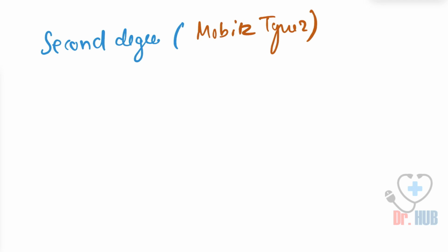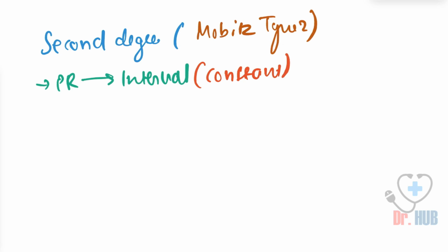The PR interval remains constant in successive cycles.